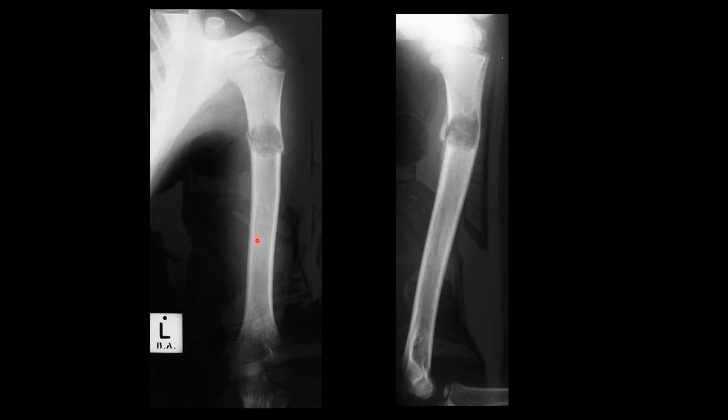So here we have a child, we have a humerus. You can assess that he has a chest cage, he has the scapula, here's obviously a humerus, there's AP from the front, here's his lateral from the side, you can see the elbow joint, and quite obviously there's a lesion. So we have a lesion in the left humerus in an immature patient. This lesion is at the proximal diaphyseal area, or you could say junction between the metaphysis and diaphysis.